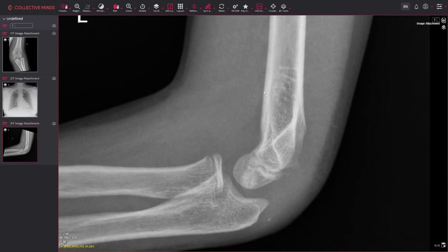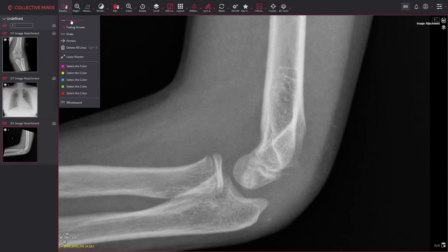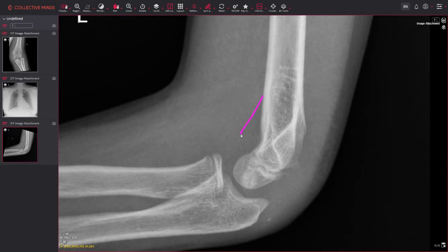If we look at this, the anterior fat pad here, and I'll draw a line around it, is in this kind of triangular shape. And what happens is, as the joint fills with fluid, this is its normal shape, it gets pushed upwards into this sail. It's called a sail sign, into this triangular sail-like shape. And you'll have to trust me, because I know it'd be easy to see on proper PACS, that there is a faint posterior fat pad. So when you see both anterior and posterior fat pads, you have that sail sign of the anterior fat pad. This implies a large joint effusion, which has occurred secondary to the fracture.